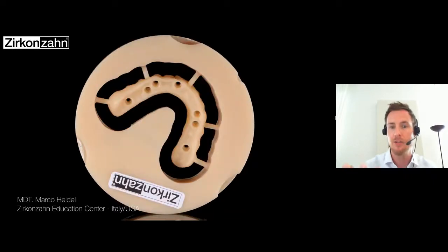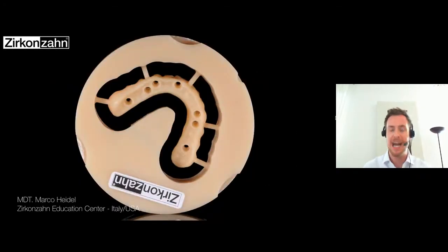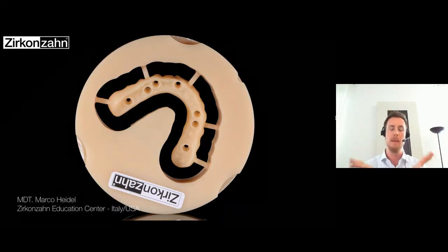And this result needs a certain time to mill. It depends on the implants, or how many implants I have. Usually 4 implants need half an hour up to 45 minutes to mill the bottom part. But I think this is quite a reasonable time. It's not that much. But the benefit is I have a completely digitally created immediate loading without any kind of conventional conversion in the patient's mouth with blood, with resin, and all those things. This restoration will fit onto the implants perfectly.